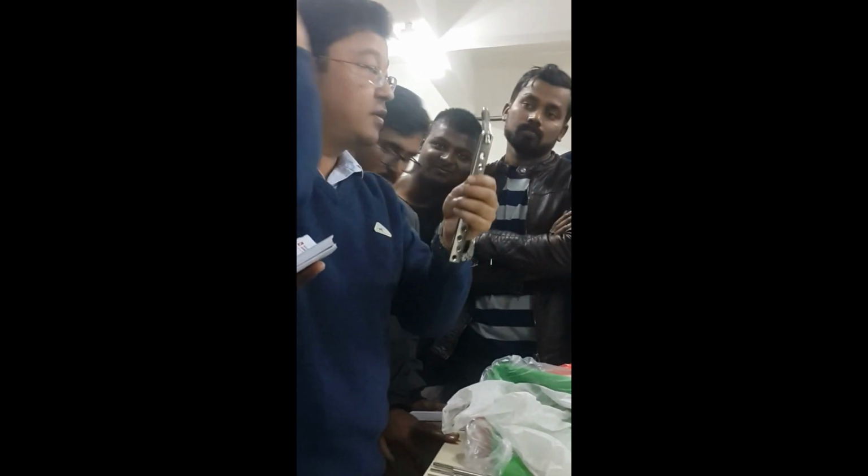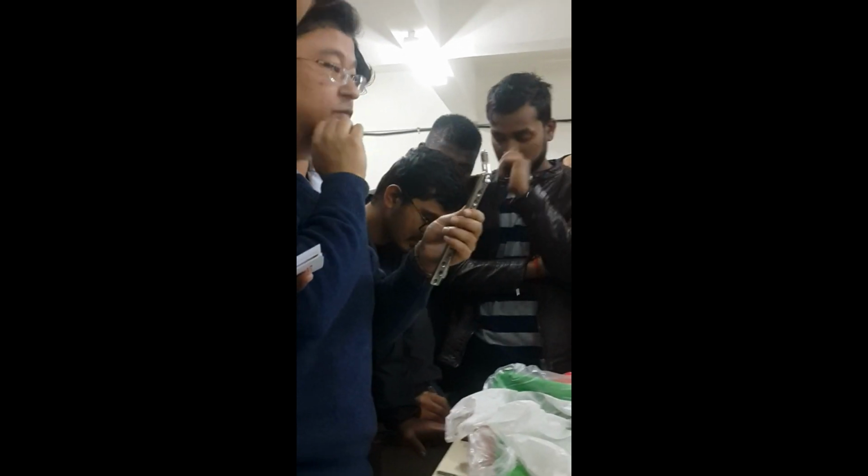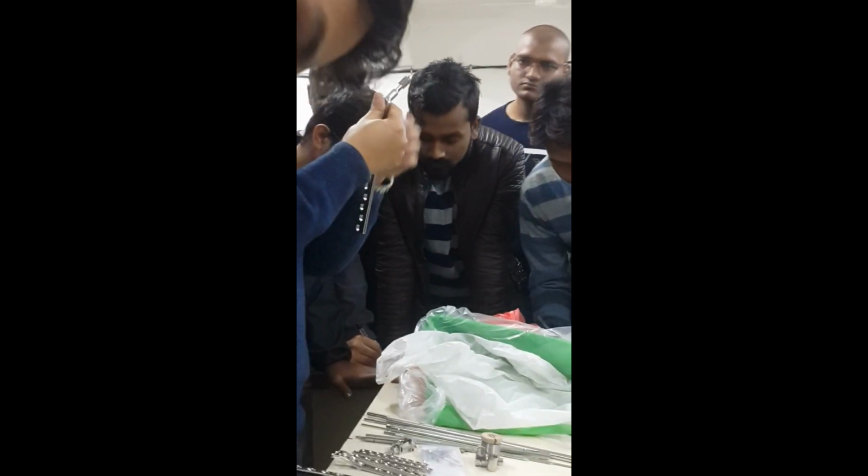Dynamic hip screw. In the dynamic hip screw, the fracture will collapse, this moves. This is very similar to this. This angle you have to know, okay? It is 135 degrees. 135 degrees. And similar to this, there is the lag screw, barrel plate.